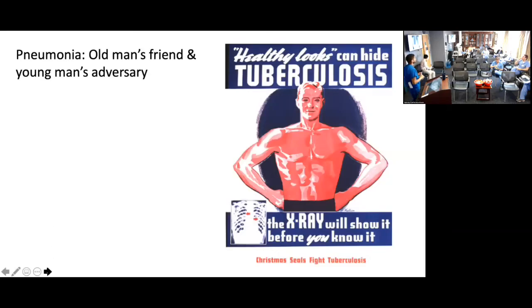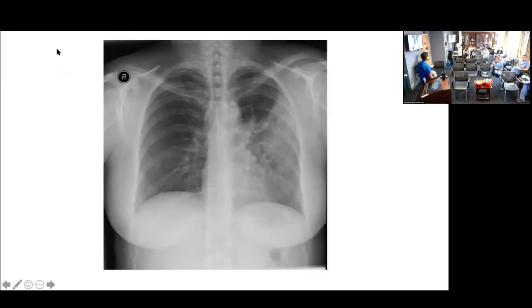Where is this pneumonia? Talk about this, guys. Pardon? In the left lower lobe pneumonia, what is silhouetted?